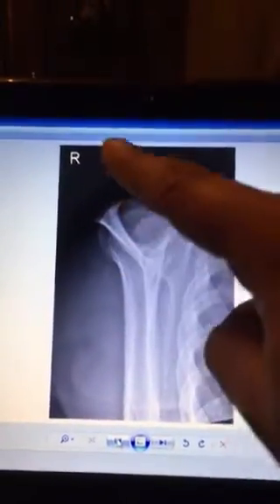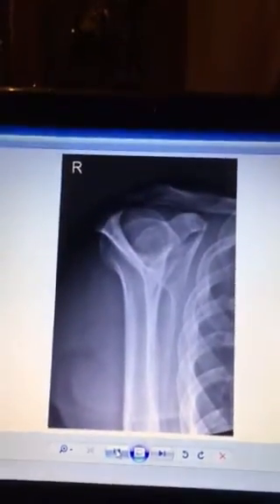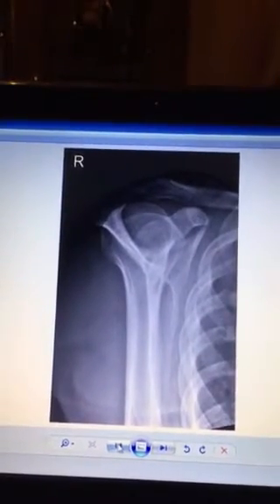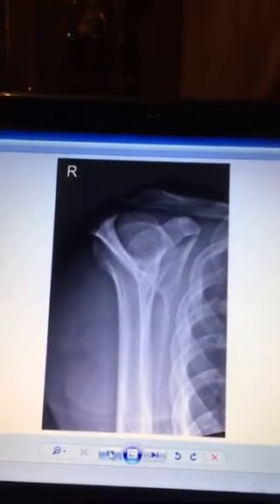There will always be a marker for the correct body part.